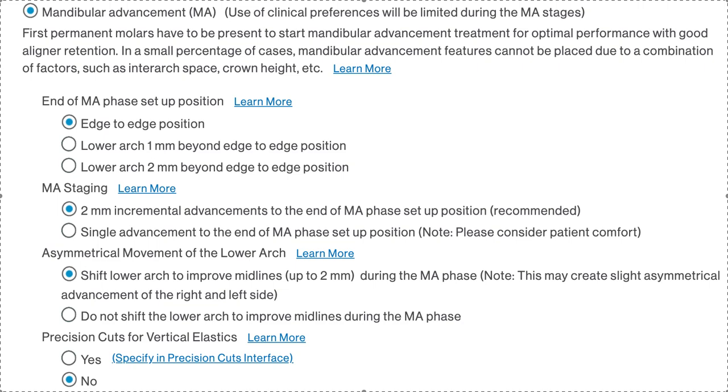So I just wanted to go over which buttons I would click when you submit it. And like I said, if you are from Align Technology and you're upset that I screen captured this and I'm making content on this, you're more than welcome, if you're a C-suite Align Technology member, to reach out to me directly. Must be C-suite, can't be sales rep. I've learned my lessons on that with you guys, and ask me nicely to take it down. But I don't know why you would, because it's just helping people and it's totally favorable, because you really don't have the best information in your portal on how to do this stuff. And people like YouTube better.